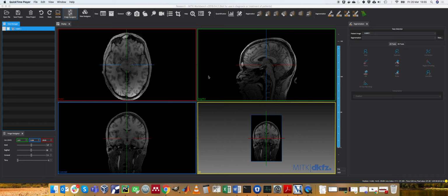Okay, in this example, this demo, I'm just going to show you some manual segmentation. So here I've loaded an MR scan into the MITK workbench. I'm using MITK. I'm relatively familiar with it. I don't have any particular preference. Other tools like Slicer will provide similar things, and a typical radiological workstation will also have similar tools.